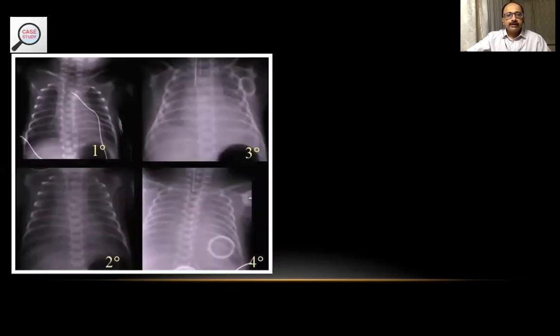Okay, now look at this X-ray. This is an X-ray which shows bilateral reticular pattern, which after some time in addition also shows air bronchogram. Further, you find that the cardiac and the diaphragmatic borders are indistinct but still visible, followed by diffuse, bilateral, homogeneous, generalized, symmetrical opacification suggestive of a respiratory distress syndrome in a preterm infant.